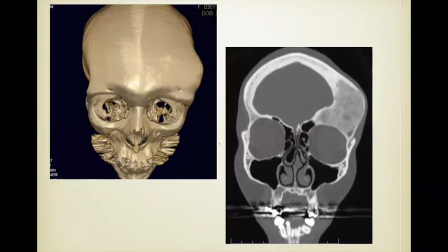Following along in this theme of the expanded skull, here we can see this patient. This is a 3D volume rendering of the skull. You can see this large bump. The patient presented because of this bump. And you can see this relatively homogeneous pattern with some areas of lucency, but by and large, this is called the ground glass appearance. Ground glass, as you know, is that kind of milky glass you see sometimes used in illumination. But this pattern of disease with this ground glass appearance is entirely characteristic of fibrous dysplasia.